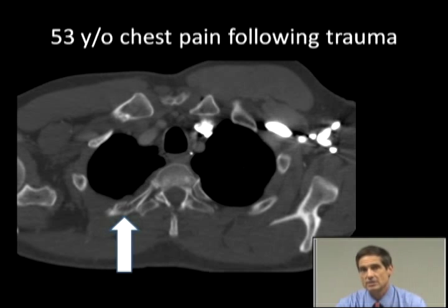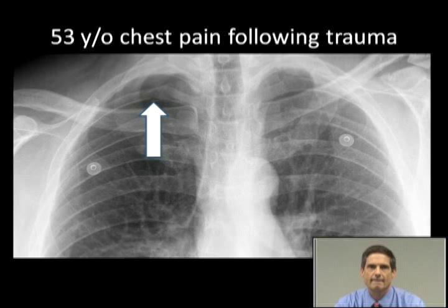Here's the cause of the patient's pneumothorax. In this case, it was this sort of jagged rib fracture shown by the arrow along the posterior upper right chest wall. And there again, in retrospect, if you look back on his chest x-rays, you can see that rib fracture as a cortical interruption on the inferior surface of the right third rib, marked by the arrow.